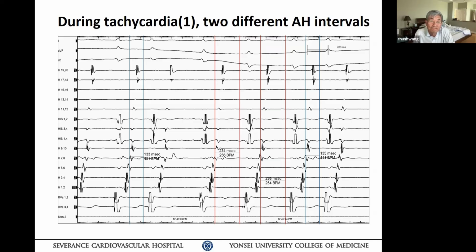AVRT. Okay? So I again recommend you guys read The Pacing Maneuver by Dr. Melvin Scheinman, who wrote it many years ago. It is an important concept: basal pacing versus septal pacing or apical pacing differentiation, and so forth. But I think regardless, the patient needs to be ablated for both.